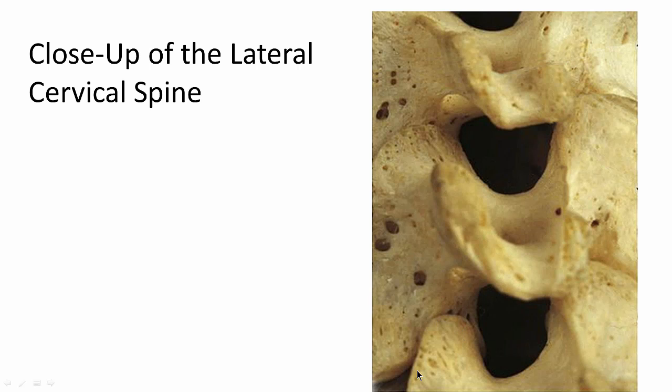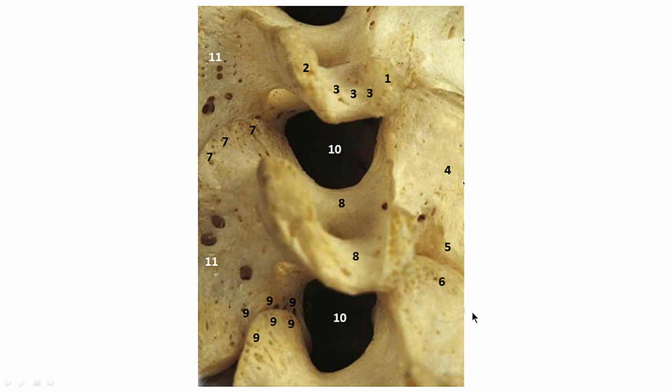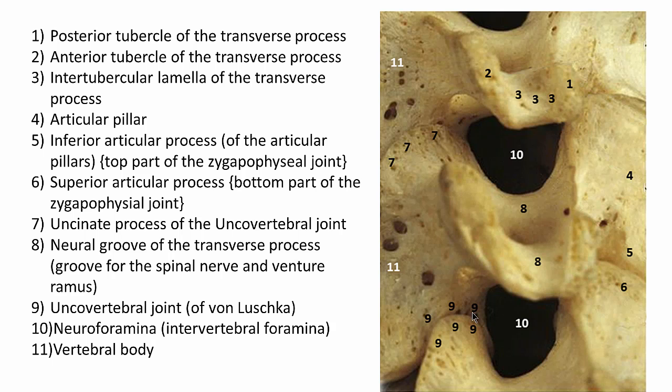You know, your chiropractors, you're going to have to be experts in all this stuff. Intervertebral foramen again, facet joint, boom. What are these holes? Those are nutrient foramen, I believe they're called. They're just where some of the arteries go in and feed the cells of the bone. So you can take the little quiz here. I think we covered everything.